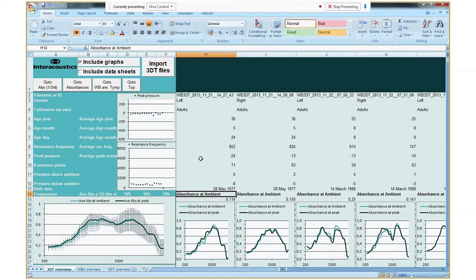Yeah, I mentioned earlier that not all the data that is available in the exported files is already used in these Excel files. If there are people that have special needs, if there is different data wanted, for me it is relatively easy to adapt the Excel file and to add a few rows at the bottom, so that you can just ask me what you need.